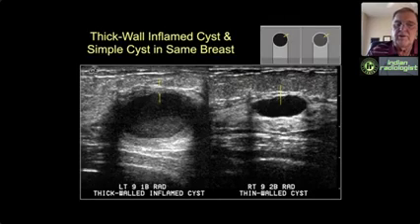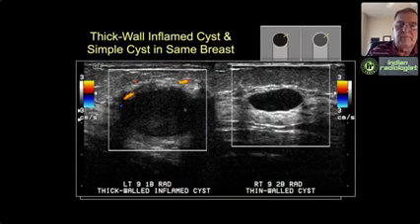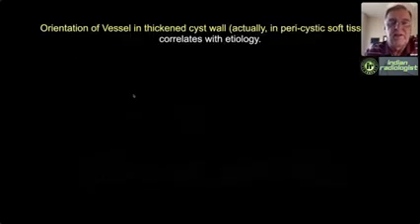So on the right is a simple cyst with a thin hyperechoic wall, nothing suspicious there. But on the left we have a debris level, which is layered pus, and uniform isoechoic wall thickening, which again is really pericystic, and we found in most cases represents foamy macrophages and/or lymphocytes or plasma cells. On the right again with Doppler we get typically no flow in a benign cyst wall, but we have hyperemia in the pericystic tissues in an acutely inflamed cyst.